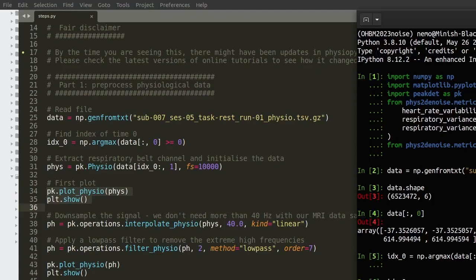We are going to run this low pass filter, which means that we keep every frequency below 2, and this is a Butterworth filter, which means that we can declare an order for the filter itself. In this case, I'm choosing order 7, so that the function to filter the frequencies above 2 is fairly steep.